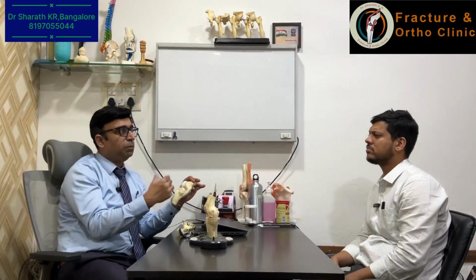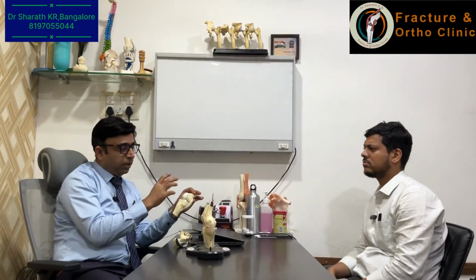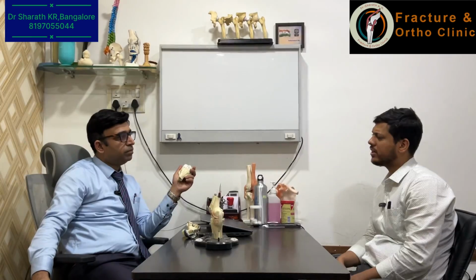Fine tuning is done by the surgeon. Of course, there is already preset data, we plan during the surgery, and then we fine tune according to the requirement for that particular patient and that particular knee. That is the difference. So what about that haptic?